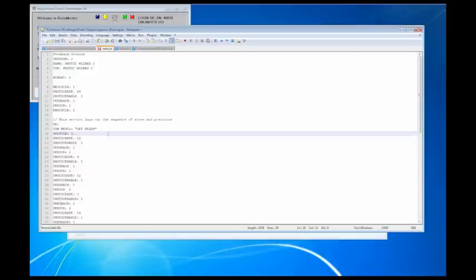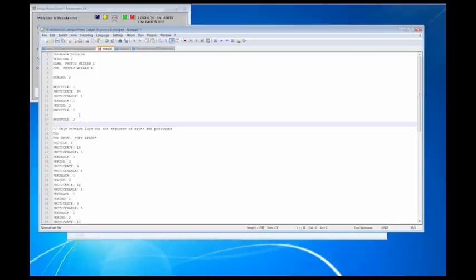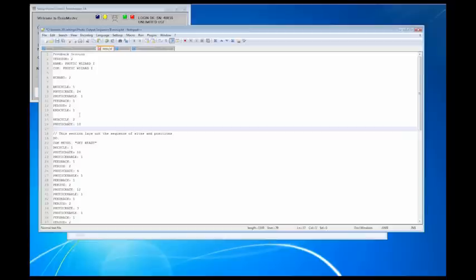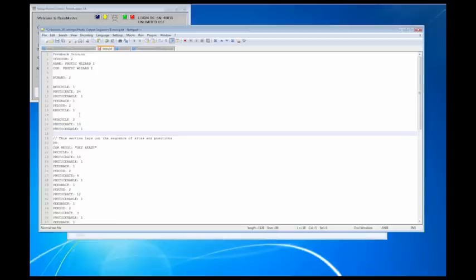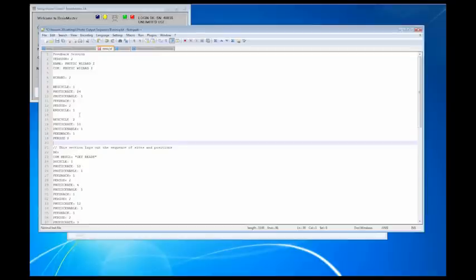Let's say you wanted to do, and let's just set that up right now, beg cycle 2. And I'm going to do a photic rate of 10, photic enable 1, feedback 1, period 2.